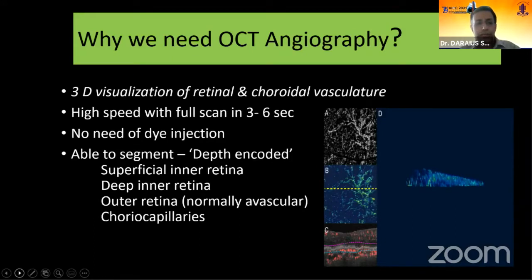We move on to OCTA. Why do we need OCTA? It gives us a 3D resolution, and the best part is it is depth encoded. So without a dye, we are getting to know the vasculature, and we are getting to know it layer by layer.